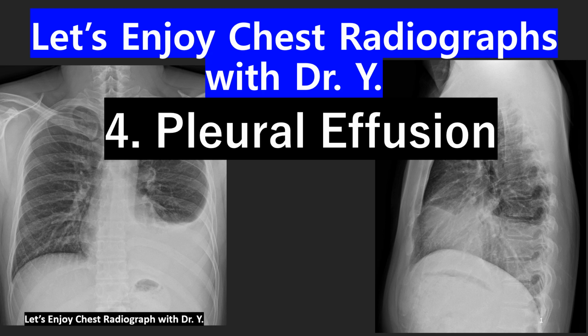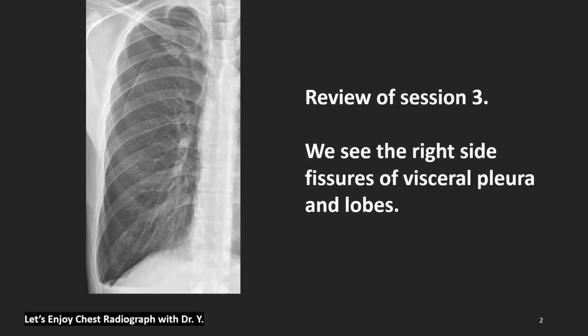Let's enjoy chest radiographs with Dr. Y. Session 4, Pleural Effusion. Before starting Session 4 of Pleural Effusion, let's review Session number 3.